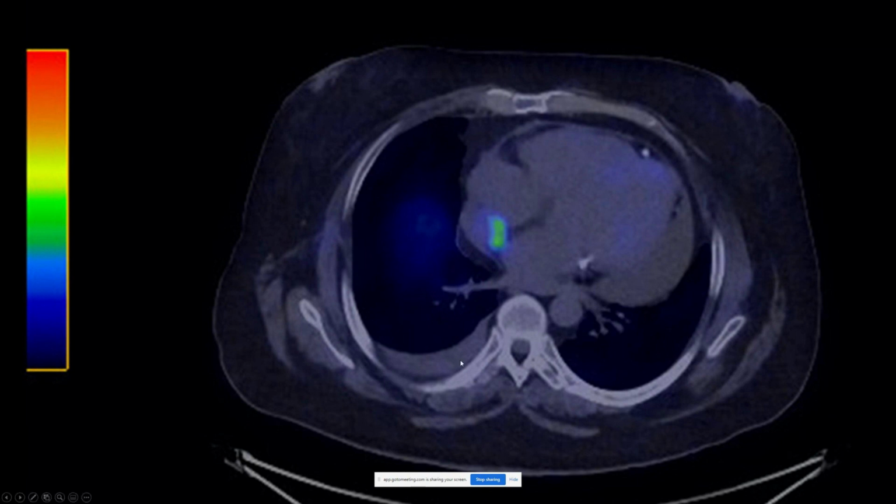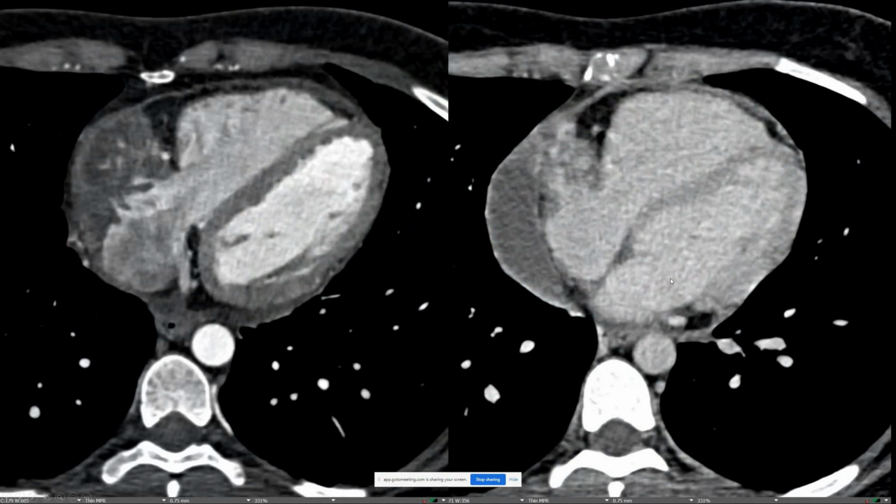And does anyone here read nukes? Well, it's positive. So I said, oh man, this is a paraganglioma, next case, right? And they went to surgery, and it was a benign hemangioma. Apparently, some of them can have enough lymphocyte activity in a hemangioma that you can get dotatate activity, which wasn't well described, but apparently is.